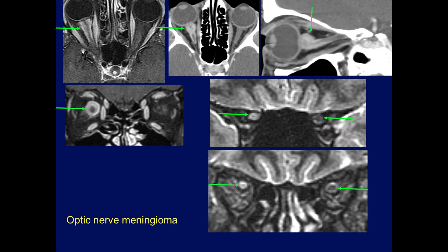And this is again like a board case, the typical expansion of the meningioma around within the sheath of the optic nerve on the sagittal view. Here it is on the coronal view, and again, the marked enlargement around the nerve. Remember that the dura extends because the optic nerve is an extension of the brain into the orbit. The dura of the brain also extends into the optic canal and the orbit, and that's where we get these meningiomas of the optic nerve within the orbit.